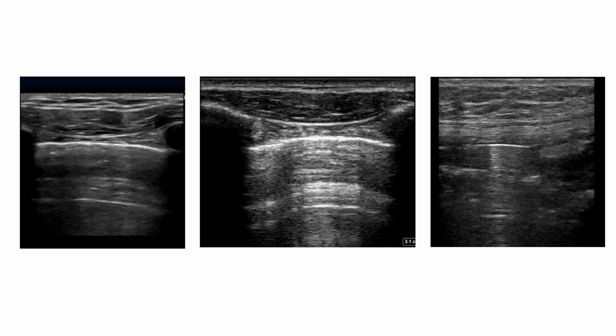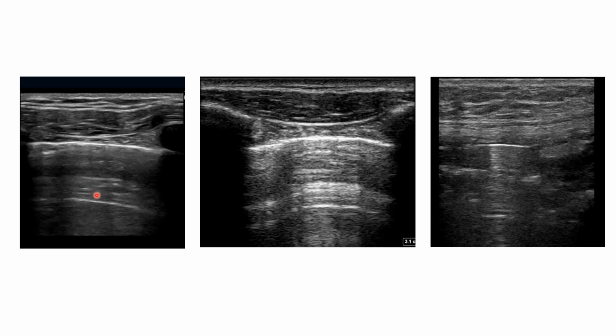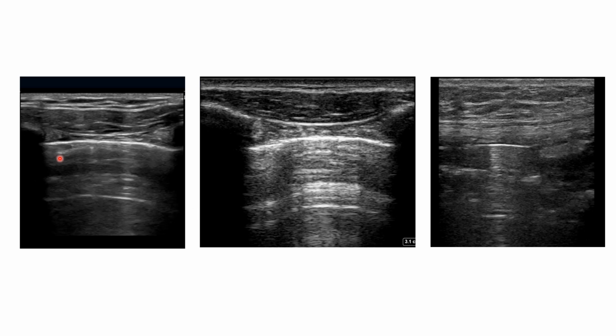We see three pictures that look quite similar. Each time we have a bright reflector and a reverberation. Also here, bright reflector and a reverberation. Also here, bright reflector and reverberation. So yes, we are looking at air three times, but the correct interpretation is necessary as the air is in three different places. So the first one, we already know this picture.